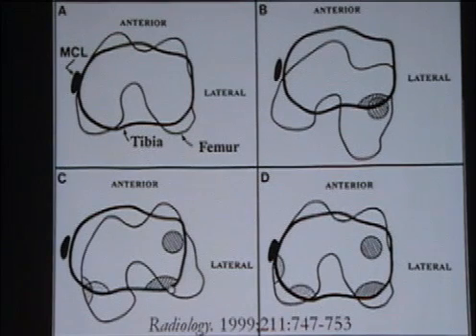Now, as the femur rotates back, remember we're keeping the tibia constant, you get the contre-coup injury. This contre-coup injury occurs on the posterior aspect of the medial tibial plateau, and then the knee comes back into normal anatomic alignment. What you're left with are your contusions here laterally that everyone knows, plus your contusion here on the posteromedial aspect of the tibial plateau.